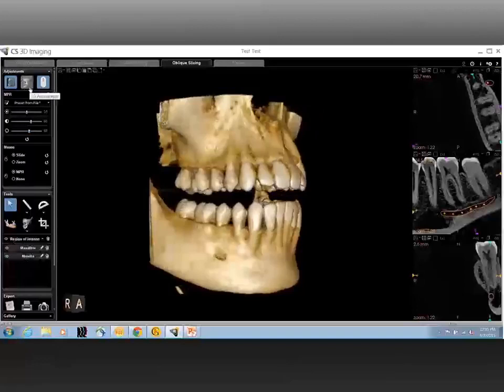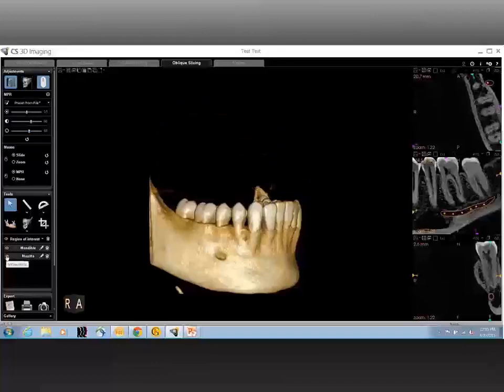Well, as you mentioned, not all of these findings can be found on this 8100 3D scan, which is our dual jaw 8x9 scan. What would you say would be the benefit of capturing a smaller field of view scan, such as this 8x9, or similar to just capturing an 8x5 single jaw scan?